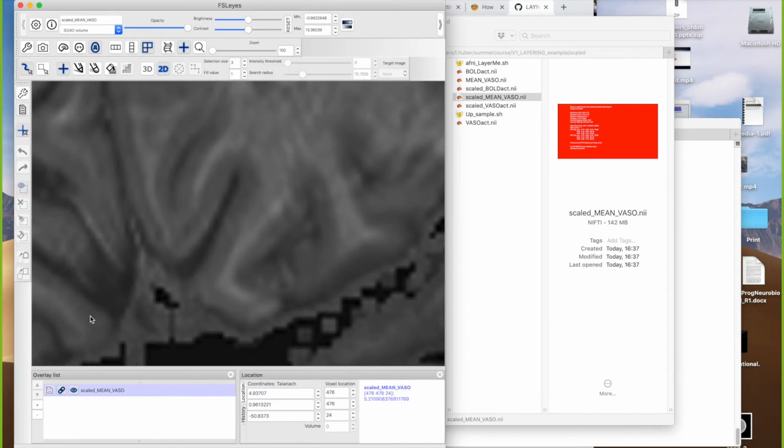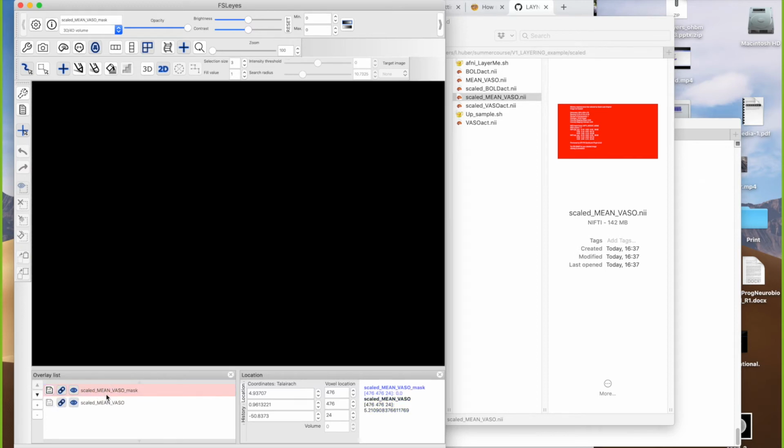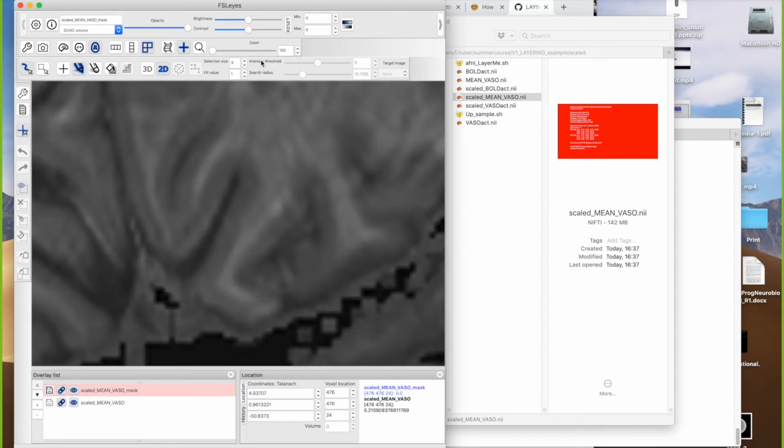So I will very quickly draw layers again. I generate a new file, which should be there in a second. Then I select my pen, make the size 1, and quickly draw it. Now you see I can also draw much smoother. And I'm lazy, so Farouk, forgive me for all the segmentation errors here.